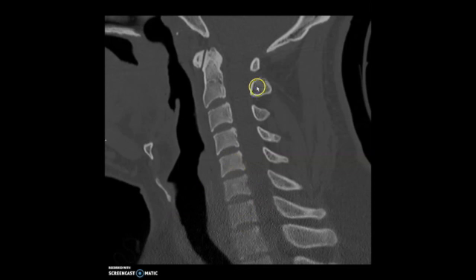And it just really helps me when I'm trying to figure out disc disease and what level I'm at, not having to continually count, not having to spend time labeling the cervical spine with numbers, which I know sometimes people will take time to do, which is great. But when you're reading a lot of cases, if you can spend a minute to learn the pattern, to do a little pattern recognition training on yourself, and every time you open a cervical spine, just point to C5 or point to C6, depending on which vertebral body you want to choose.